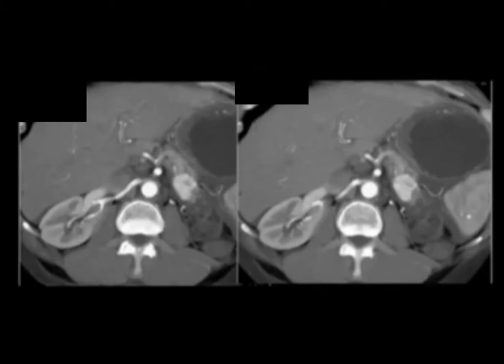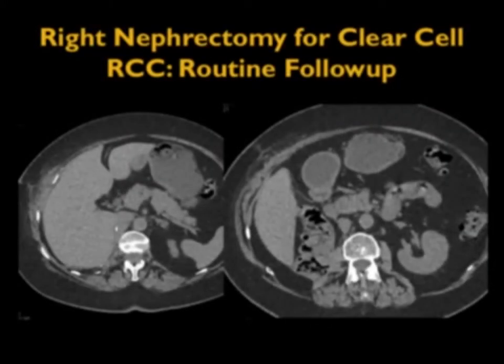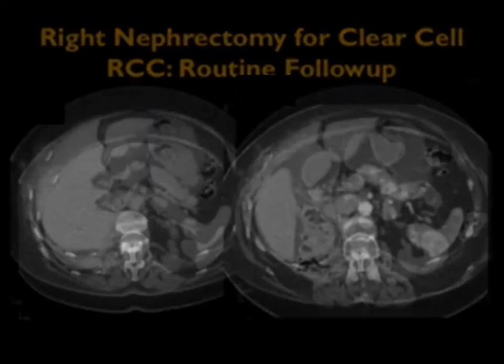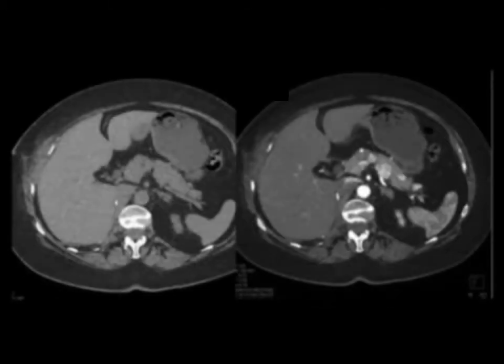Obvious lesion, arterial phase. So very important why protocols are so important. With the right protocols, you have a very obvious mass and save the patient's life. With a poor protocol, you miss the pathology. Look at this case, another example, right nephrectomy. Look at the pancreas non-contrast, looks A-OK. Look at the pancreas with contrast. Look at those multiple vascular metastases on the patient's arterial phase imaging. Look at these images. Look how obvious those lesions are. And here's just another image.